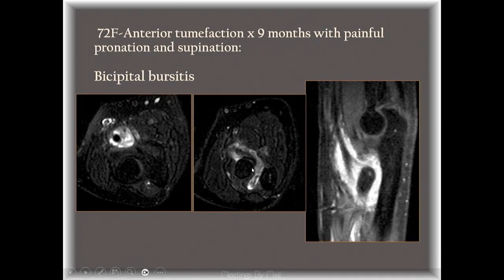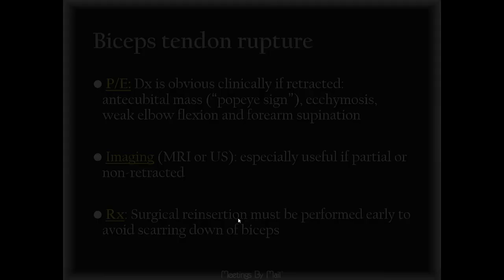This was out of order. This is the old version again. This was a case of rheumatoid arthritis with distension of the bicipital radial bursa. Just wanted to show you a companion case of a non-mechanical cause. This is rheumatoid. So inflammation, pannus, affects synovium and bursae. Well, bursae are lined by synovium, so synovial-based processes can affect it.